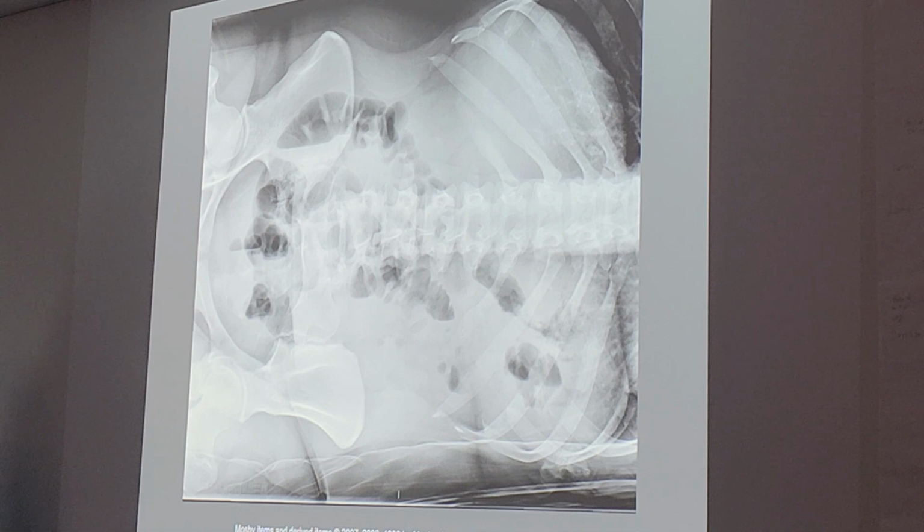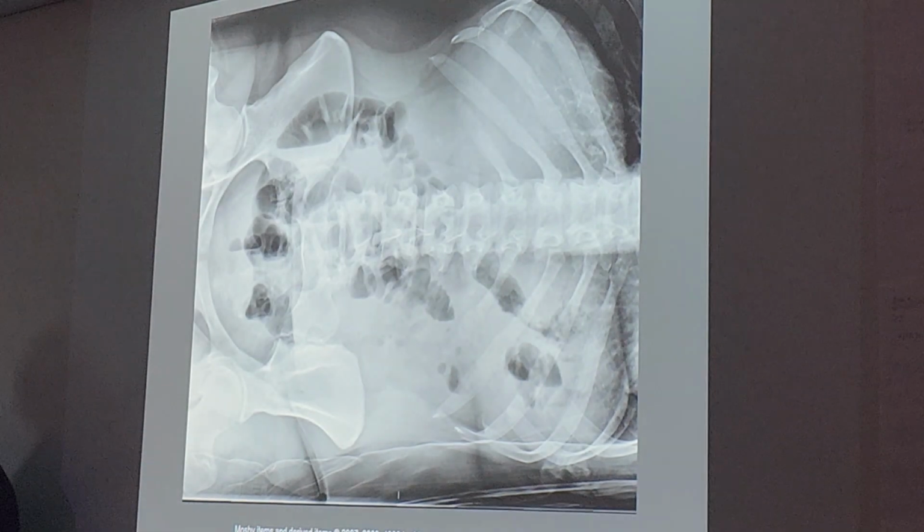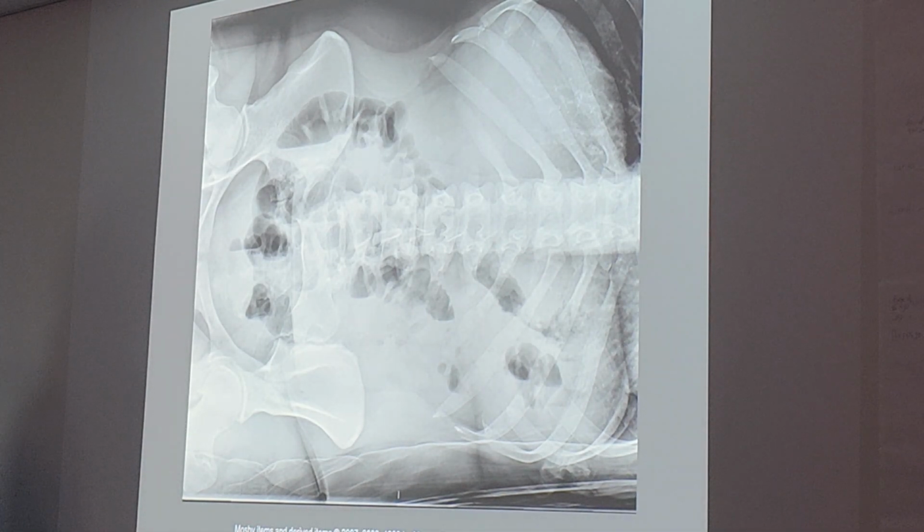What about centering? Centering is also 2 inches above the crest. I think it looks pretty good. It's good. What about the spinous processes? They're going to be wonky because earlier we said that the patient's rotated. Oh, yeah. So it's not going to be in the midline, right?